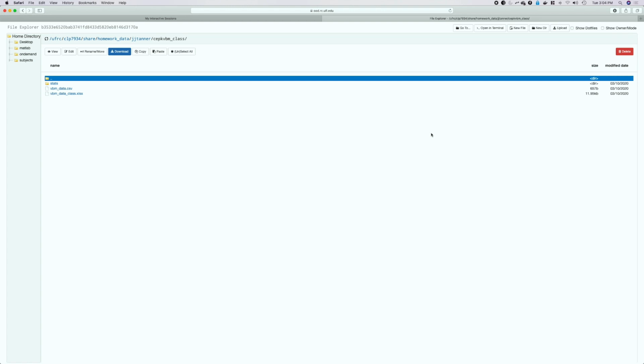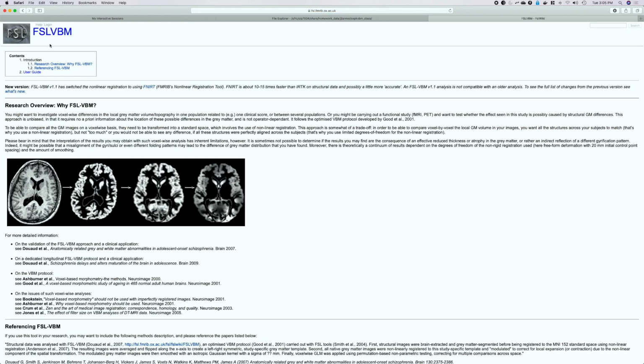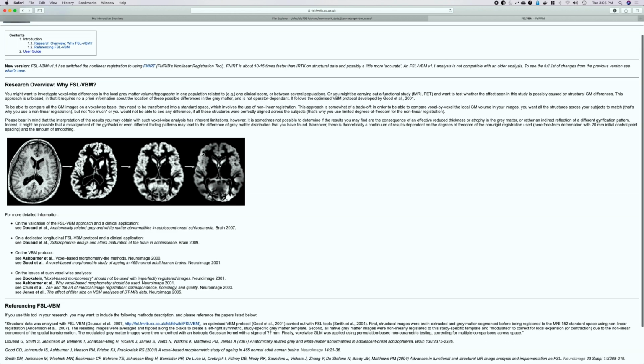Part of this, we are going to actually run statistical analysis using the GLM that we produced in the previous video. So for this, I'm going to first open up a new browser window just to see what FSL has about the VBM analysis. So I can do a Google search for FSL VBM, and we can click on the link.